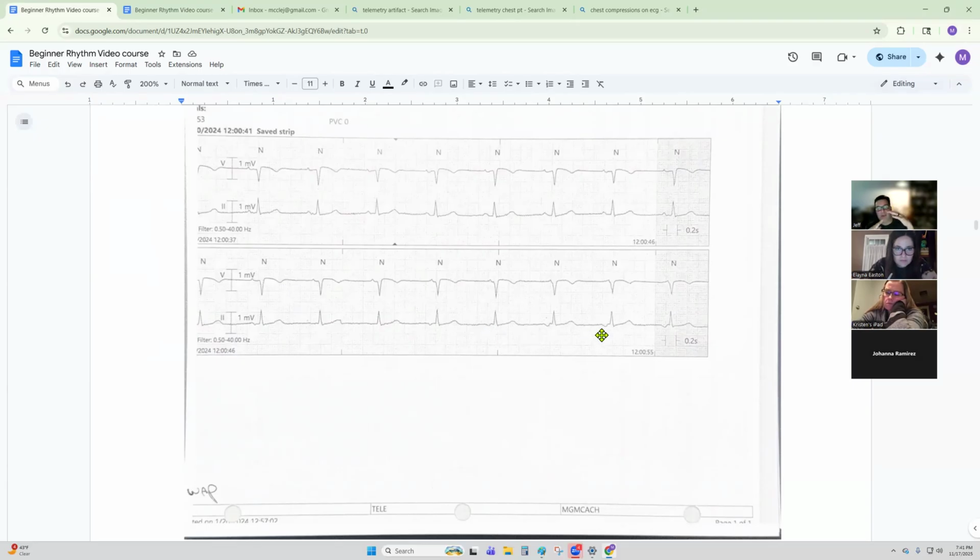So with a true classic wandering atrial pacemaker, it's competing pacemaker cells. It goes SA node, atrial chamber, junction, and you'll see the cycle of going back and forth. But saying that, sometimes it just can sit in one of those P waves for a long period of time. You can say, oh, that's just junctional, and then they'll come out of it. In that small little burst, yes, it is junctional, but the bigger picture, it is a wandering atrial pacemaker.